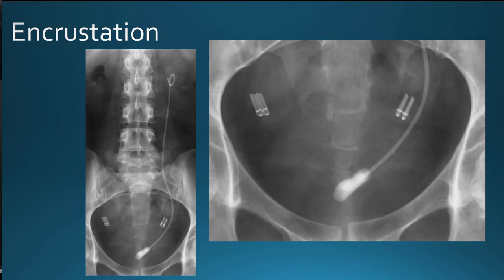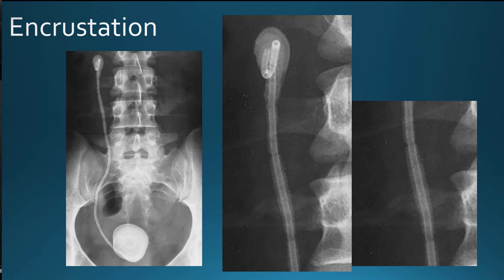Here's a distal coil incrustation. The coiled part of the catheters tends to be more prone to incrustation than the more central straight portion of the stents. But in some cases, the entire stent can be encrusted, as in this case.